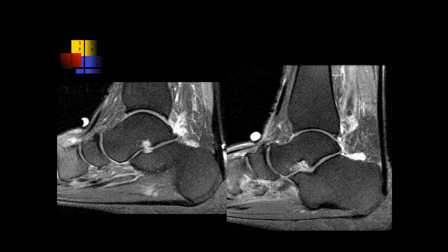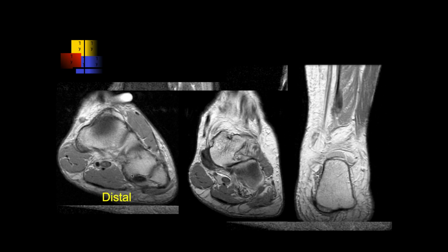Thanks, John. So there's a soft tissue marker right over the dorsal navicular, in the region of the extensor tendons. But judging by these two components, they look okay, I think. There's some signal beneath or plantar to the navicular, right there, and it looks kind of abnormal in that second image. So there's a complete tear of, I'm trying to think which flexor tendon, and on the second area it looks like it's proximally retracted. Is this the flexor hallucis longus? If you had all the images, you could follow it down and see.